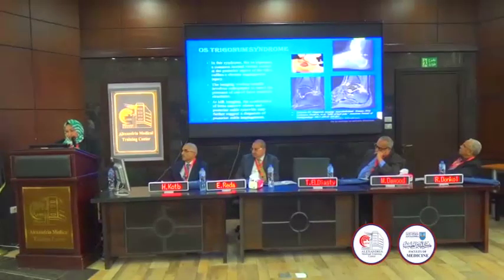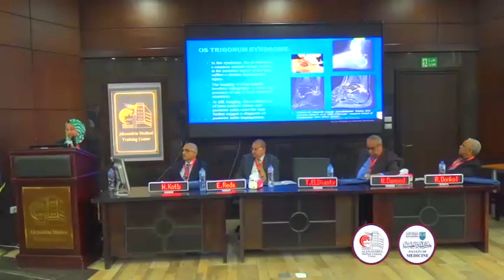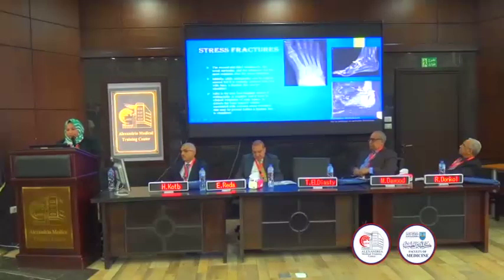The os trigonum syndrome, in cases of posterior ankle impingement, will cause hindfoot pain by presence of these accessory ossicles at the posterior aspect of the talus, and the presence of edema at the accessory ossicle. With more advanced stages there will be disruption of the synchondroses and crossing of the edema to the parent talus, and associated synovitis at the posterior aspect of the ankle joint and the subtalar joint.